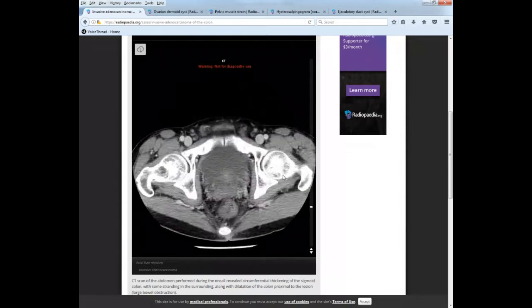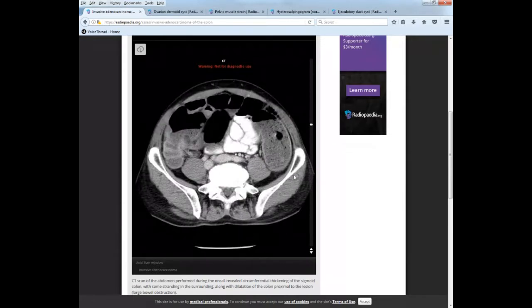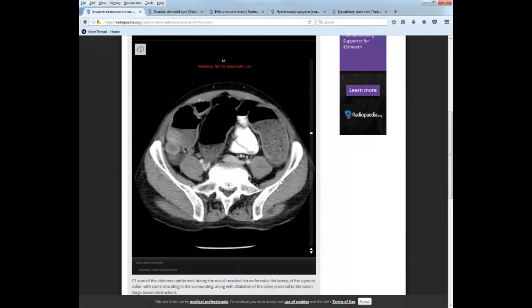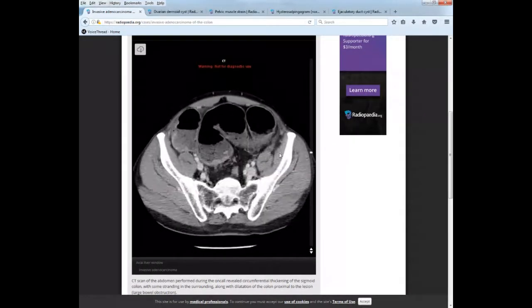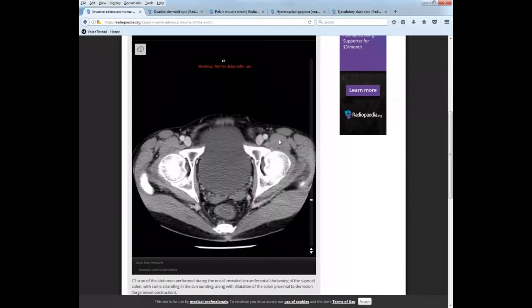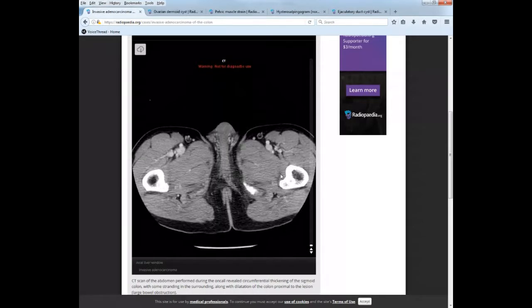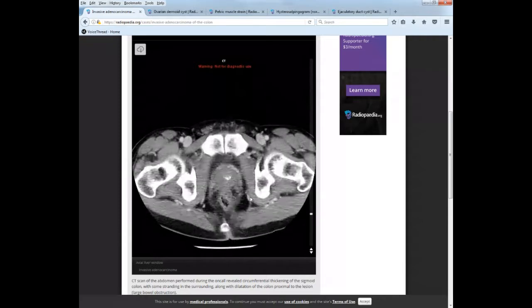Okay, so we'll start back up. Back up. Psoas muscle. Here's your ala of your ilium. There's your iliacus muscle in here. They're going to combine to form the iliopsoas muscle here. Follow it down until it inserts at the lesser troch. Okay, let's go back up a little bit.